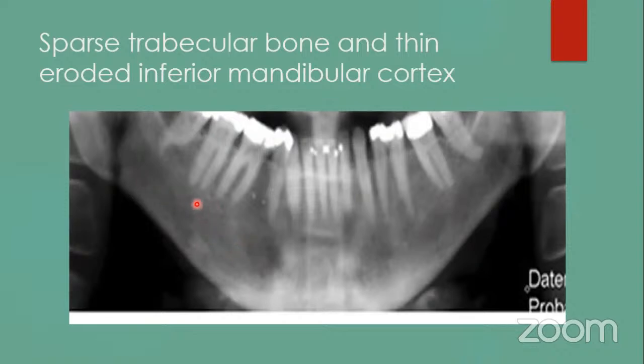So for you to really get to know whether anything has happened, you have to know how a normal mandible looks like, then you can compare with this.